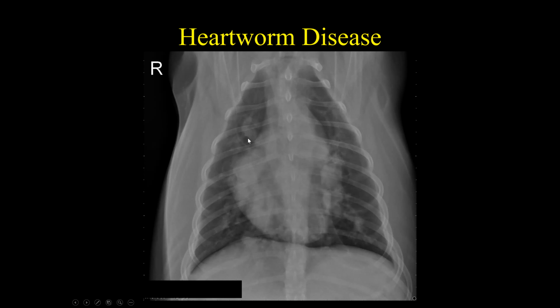So look at this vessel right in here. It's coming out in here and it just stops right in here. Here's another pulmonary artery coming out in here. This one's huge. It comes out here and look at this one here. It kind of winds around. It's really dilated here compared to even right in here. And so that's typical of what you're going to see with heartworm disease, a vascular pattern where the pulmonary arteries become really big, dilated, tortuous, and pruned.